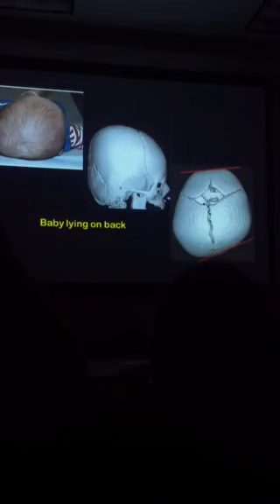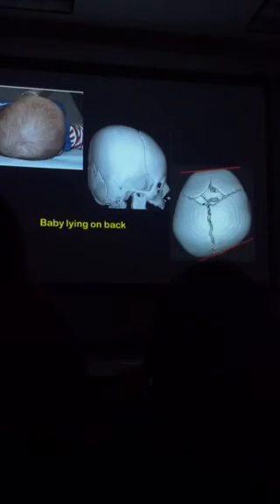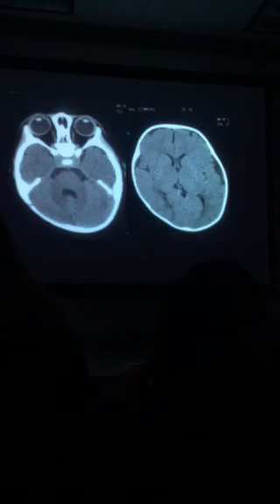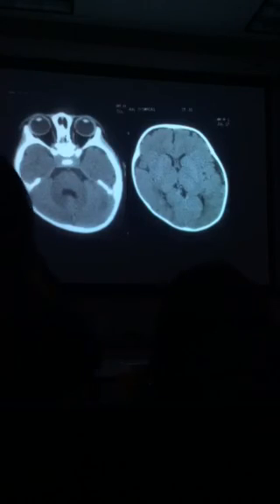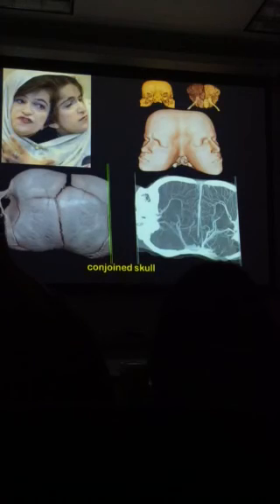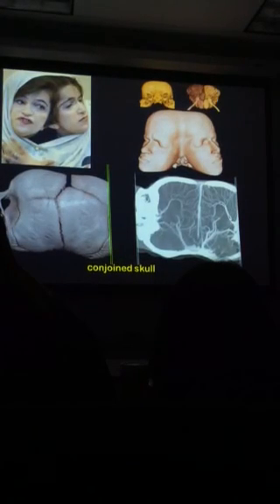It's malleable. In fact, when these kids fall and they hit their skulls, they get what's called a ping pong fracture. It kind of dents the skull rather than fractures the skull. They will get fractures, but this is a kid who's been lying on the right side too much. It'll eventually fill out. As the kid gets older, it'll change its shape. And the kid will get hair, and you'll never know.